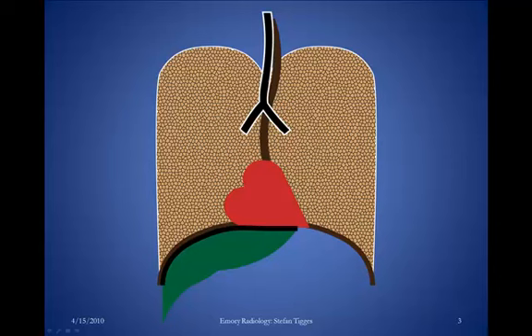So what does free intra-abdominal air look like? On this diagram, hopefully it's clear that the most frequent finding with free intra-abdominal air, almost exclusively on an upright radiograph, is going to be air beneath the right hemidiaphragm and the liver. Normally those two soft tissue density structures are opposed, and you're not going to be able to see air there unless you have an abnormal air collection, usually because of a perforation of a hollow viscus. But you can have other etiologies. People who are, for example, on peritoneal dialysis may have this finding, or people who've had recent surgery or abdominal instrumentation.